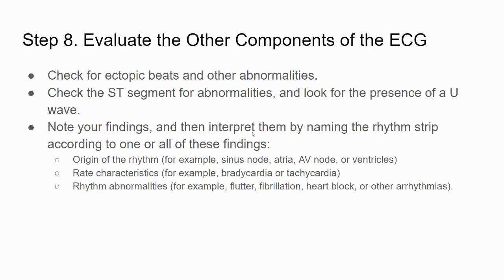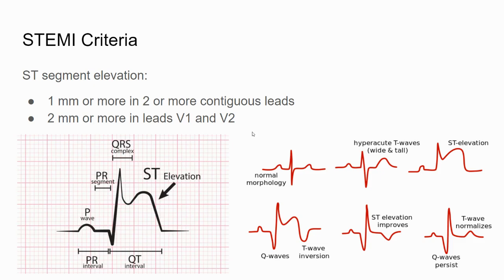If it's going fast, and you can see that the QRS complex is very wide, so you can tell it's coming from lower down, then you might call it a ventricular tachycardia. One of the things that we tend to shock is pulseless ventricular tachycardia. Again, this will all make more and more sense the more you go through your education here.